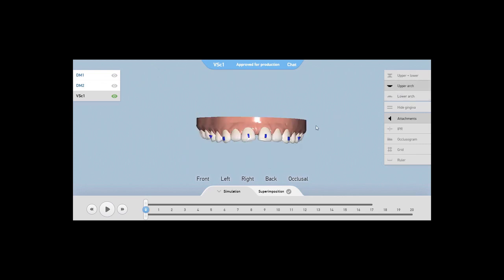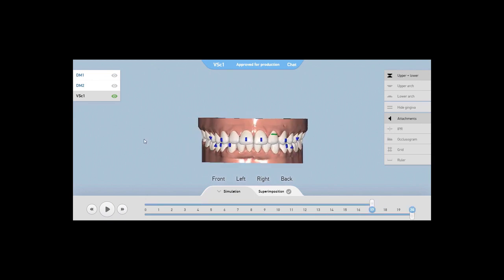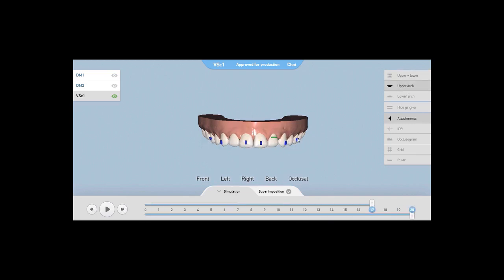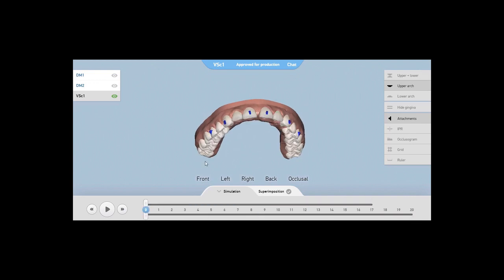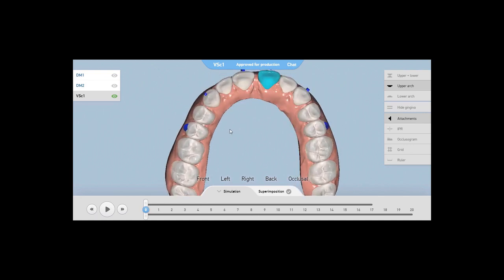This pathology is considered rather mild for aligner treatment, and here we can see the virtual setup and the initial and the finish position as it was performed in the Exceed lab before and after the treatment. If we examine the upper arch, we can see that there is diastema between the centrals, but also some other spacings or tremas in between the canine and the premolar.